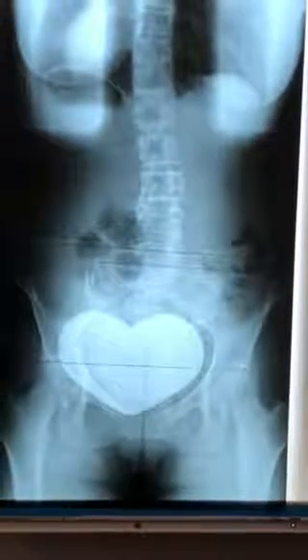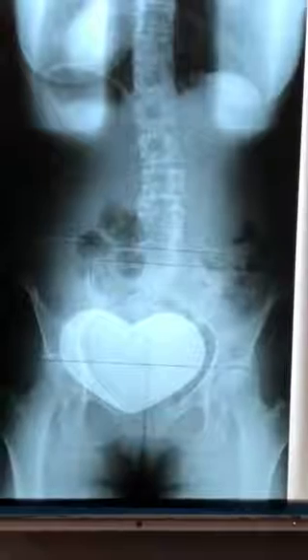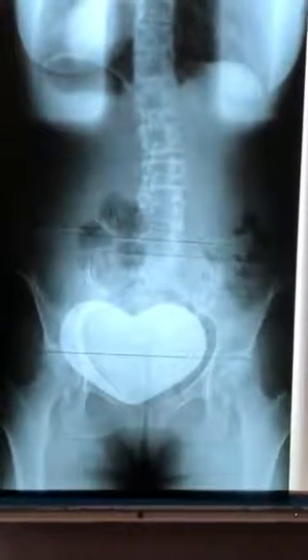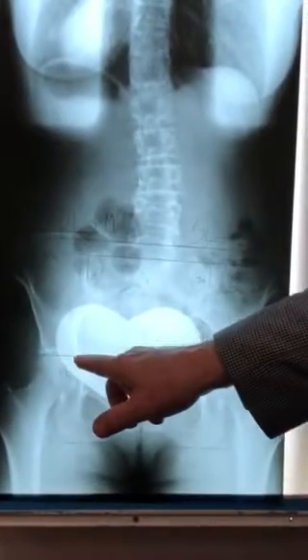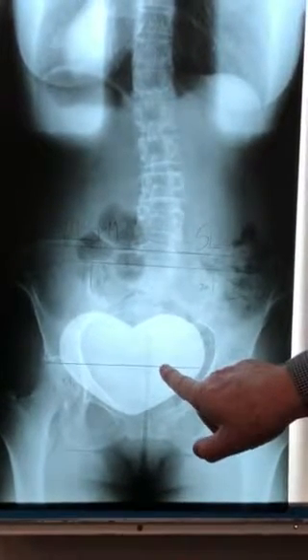This will be a very short review of the X-ray analysis that we're going to use for the Gonstead Analysis Lab Final. So the first thing we're going to do, question number one, we're going to ask you to identify the femur head line. That's the line drawn across the top of the femurs. I want you to point to it, put your finger on it.